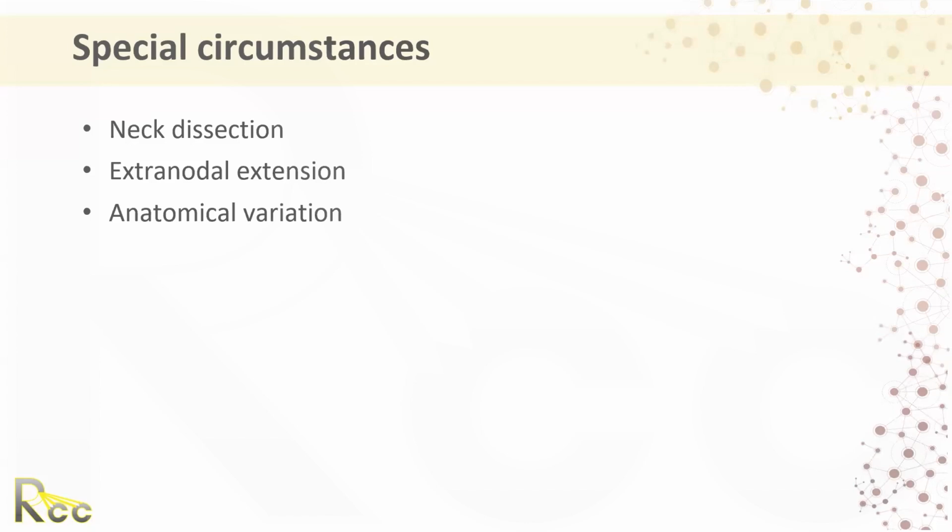No, that's a great question. And that comes down to the variation in anatomy that we can see. Sometimes to cover level 4 entirely, we don't need to go all the way to the manubrium. Sometimes we can stop short because we end up going into the superior mediastinum. And I only go into the superior mediastinum if I'm concerned about a very low tumor like an esophageal tumor or a hypopharyngeal tumor, or a thyroid tumor that has disease extension inferiorly. But that's a good question.